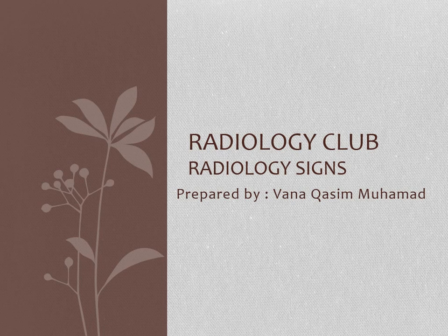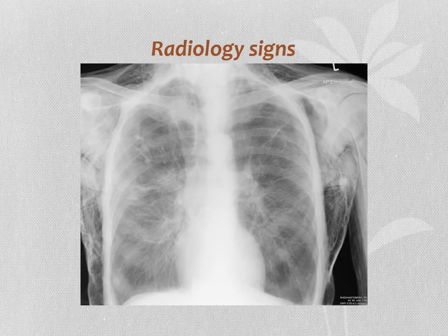Today we will talk about four radiological signs. We start from the chest. Anyone know the sign? Okay, so what's the sign? Anybody has any idea? Okay, what do you see? Describe.